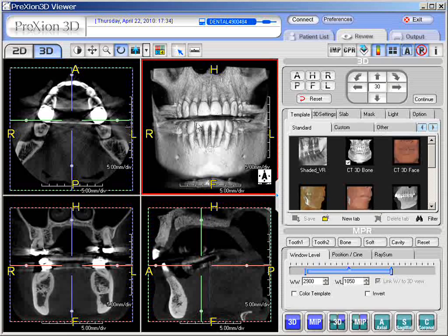Please review these, play with your mouse a little bit, get used to it. Once you get really familiar and comfortable with your mouse, it's like second nature when you go to the other features of the software.